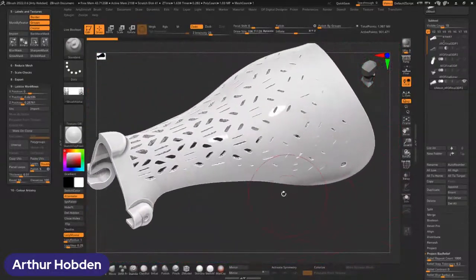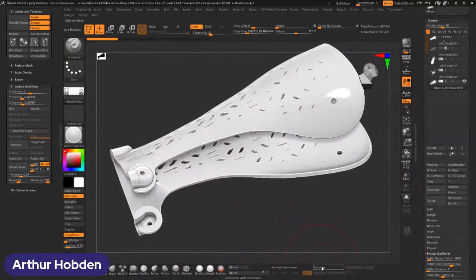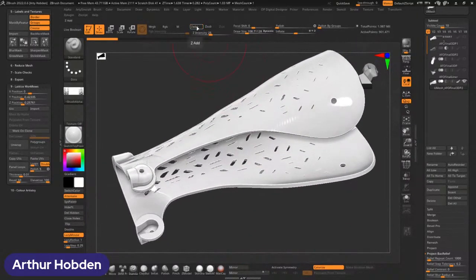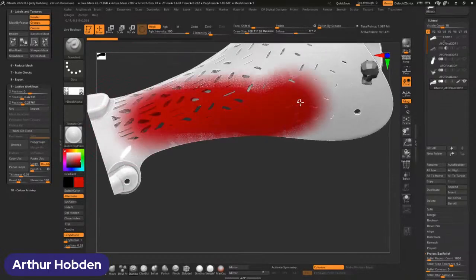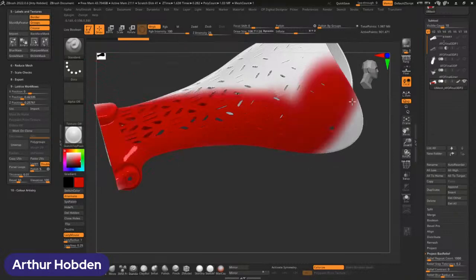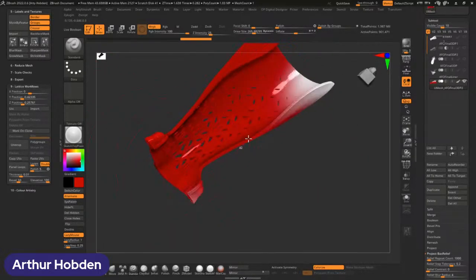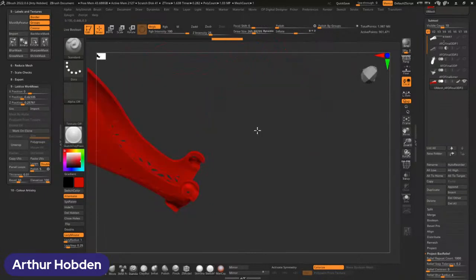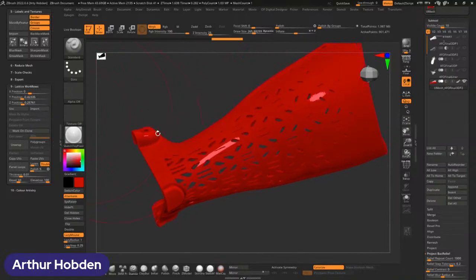So let's talk about coloring now, because you can make color files for this. All we've got to do is hit Colorize and change our brush style from adding and subtracting geometry to doing RGB and material RGB values. So if I now change this to red and drag, you can see that we've actually started creating color for this. So I can go and find my Coca-Cola red and quickly spray paint this whole thing red. So this is what the color is going to be for this part too.